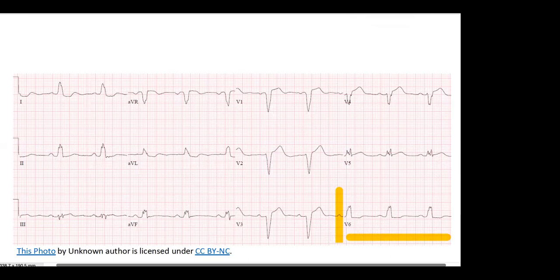Just a minute. I would advise us to switch off our microphones if we are not contributing. Continue, please. Okay, so the first thing is that it is prolonged. The time appears to be more than 120 milliseconds, and then we don't have a Q because normally the Q is below the isoelectric line, but in this one we are just from P and then we are ascending up.